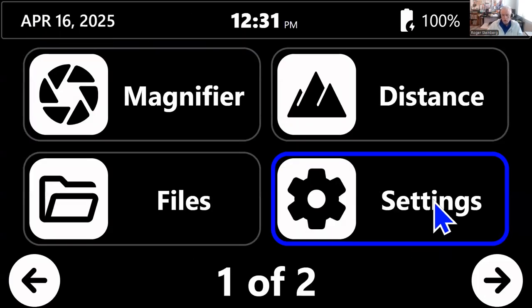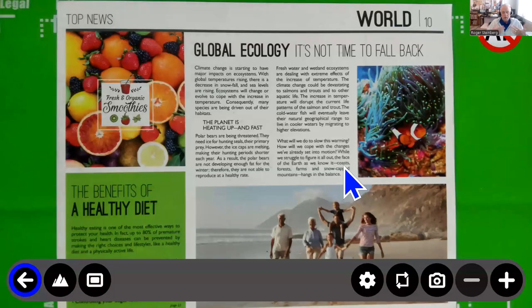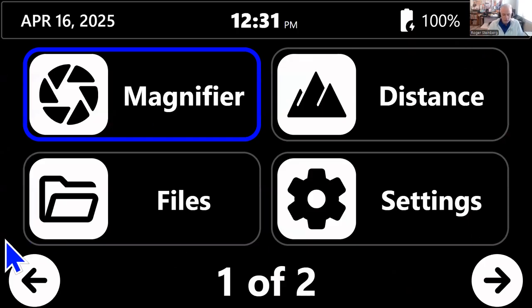So that's a tour of all of my available settings inside of Prodigy to give you a sense of what's there. I also wove in some of the new 1.3 features as well. So now let's come back to what I've set up. Oh, let me back out of here very quickly. Remember, we set it to 4 icons here.